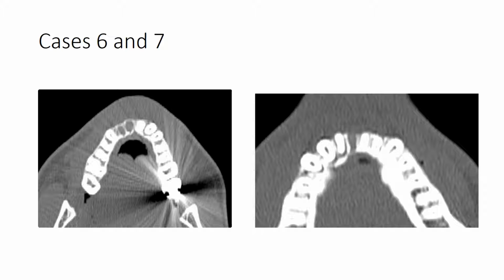I'm not sure it needs to be that hard and fast of a rule. I think if the patient is walking and talking and doing okay, maybe you don't need that. You could say something like, if there is concern for aspiration, a chest radiograph may be indicated. Something like that. But again, the finding for an avulsed tooth is an empty socket. In this case, it also looks like it probably has an alveolar fracture as well.